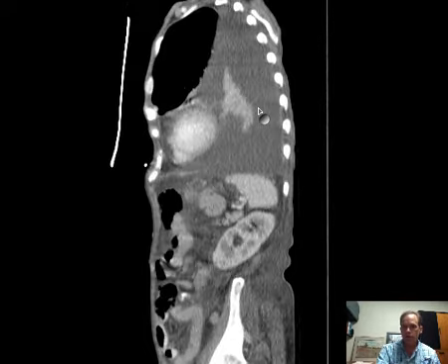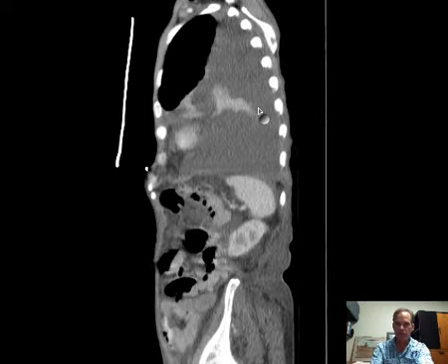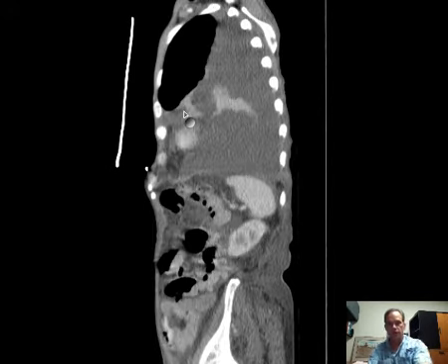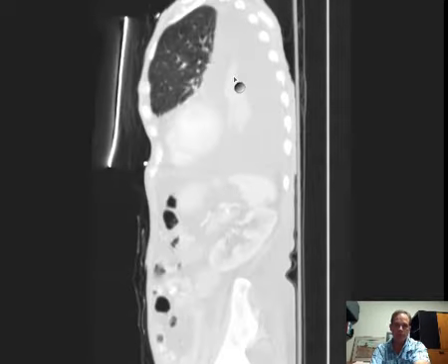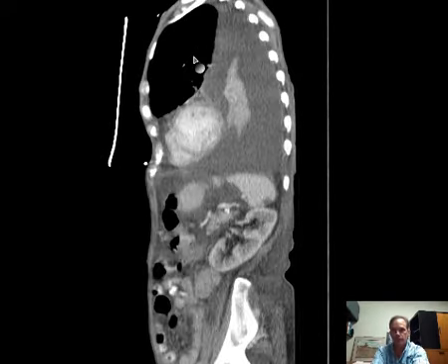Now, there is no middle lobe on the left. There is something like it, which is the lingula, a component of the left upper lobe. And here's that lingula. So now you can see that the left lower lobe is atelectatic. The lingula of the left upper lobe is atelectatic. But like on the right side, most of the left upper lobe is fairly well aerated without any really clearly demonstrated atelectatic portions.